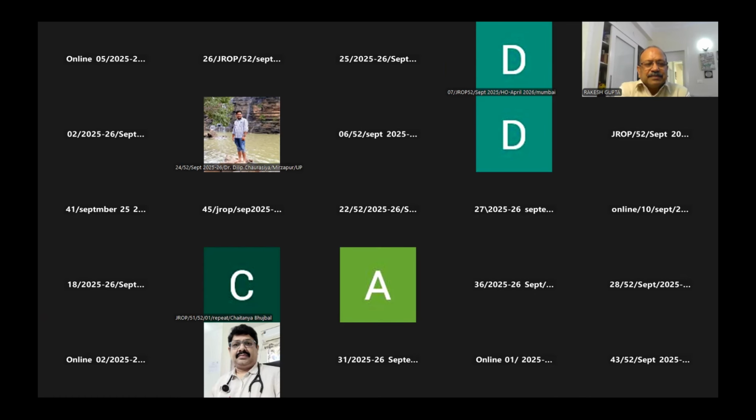Sir, I have a question: how can we differentiate between dyskinesis and aneurysm, as they both have bulged out segments? Dyskinesis will always be a bullet-shaped LV when the segment is bulging out. Aneurysm would be, the apex would be rounded in shape. Akinetic, dyskinetic segment will become aneurysmal. So if the apex is rounded, it's always aneurysmal. If the apex is triangular in shape, then fair chances are we are dealing with dyskinetic or akinetic segments.